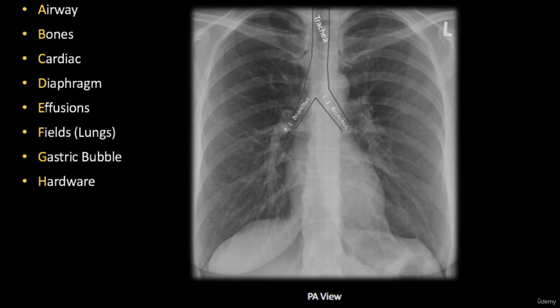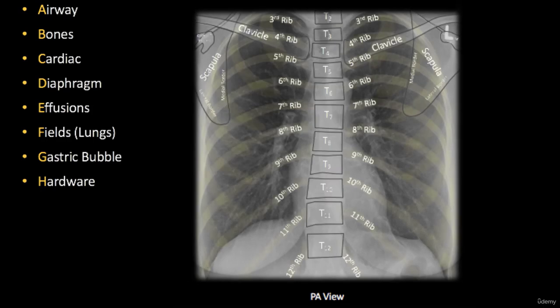It seems like the vertebral column is in front of the heart on this picture, and in fact it is true. It's a PA view. That means the picture was taken with the patient touching the film with his front. It is a necessary condition to evaluate the size of the heart precisely.